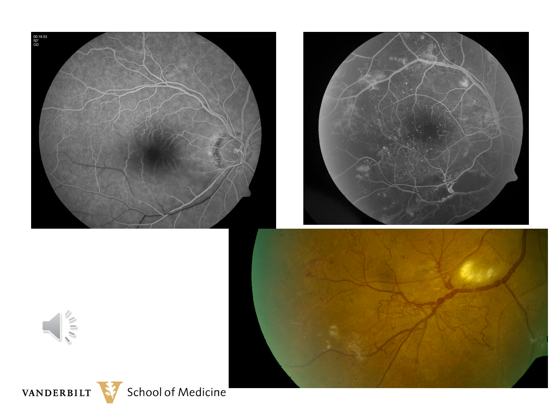You can appreciate the darker areas inferiorly where he has no capillaries. Then compare this darkness to the relative hypofluorescence of the artery occlusion on the upper left angiogram, where the capillaries are still intact, but the retinal edema gives the blockage of the deep retina and the choroid.